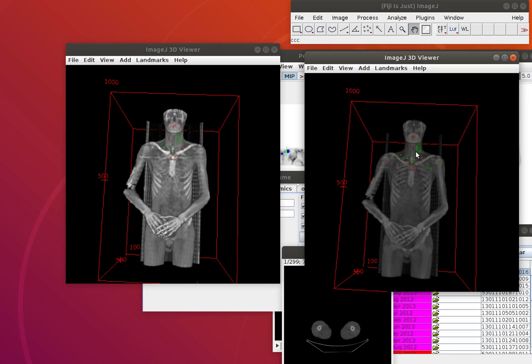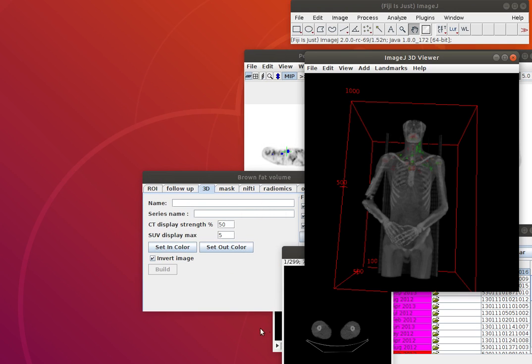And you can see that the CT part is shining out less clearly because the CT part is attenuated. But since I'm primarily interested in the PET, I would prefer this to this. Okay, so let's erase the BBB and leave only the CCC.